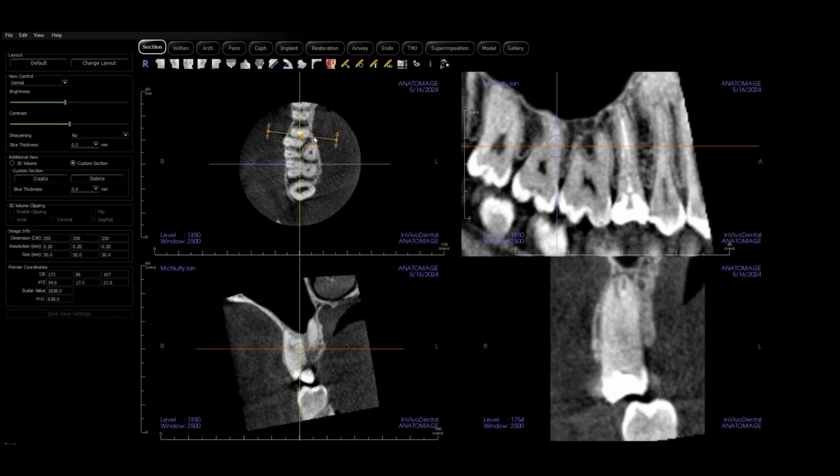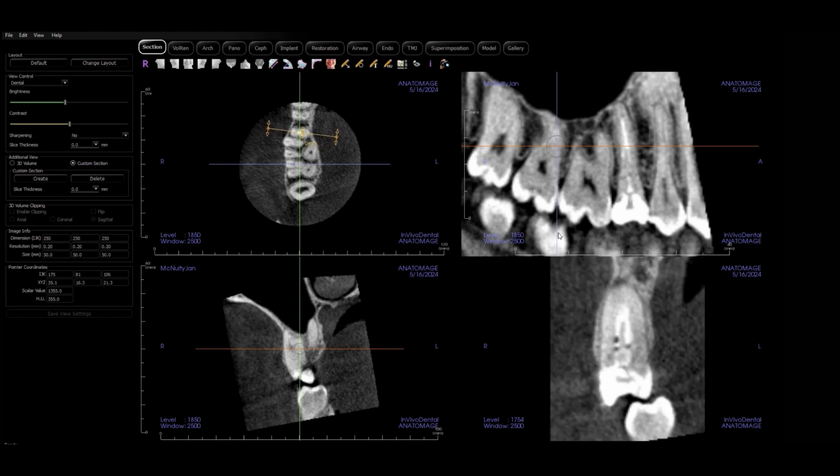Yeah, definitely a 2-1-2. Let's start with the 2-1 situation, that more coronal section. It's not uncommon to try to get rid of this isthmus of the tooth in order to create more of an open canal. I can't say that there are studies to prove or disprove the following comment, but I don't think this adds any structural integrity to the tooth. As I say that out loud, I feel like I'm saying to myself, of course it helps. But in reality, you're more likely to have issues due to lack of proper obturation by having that there than if you removed it.